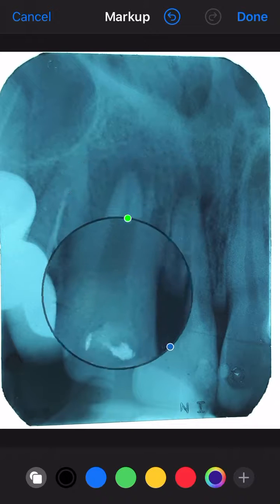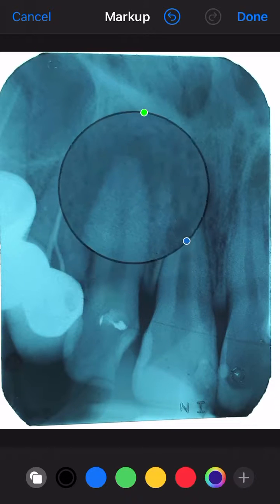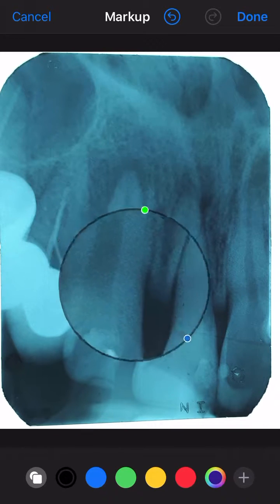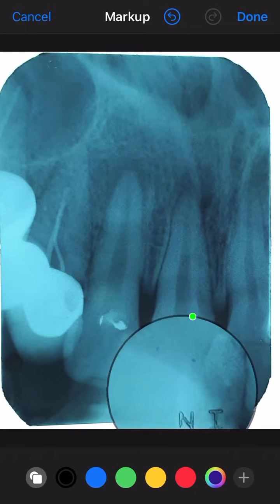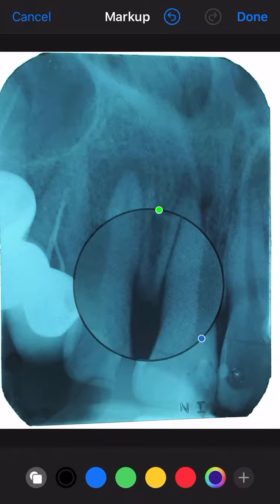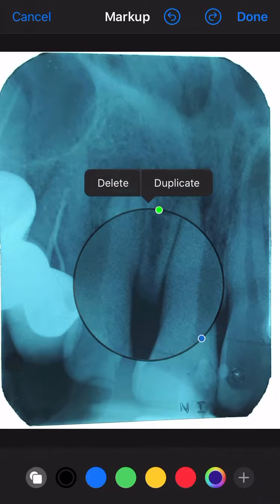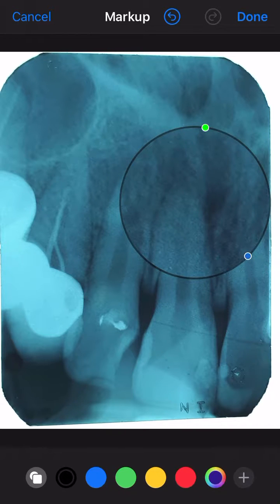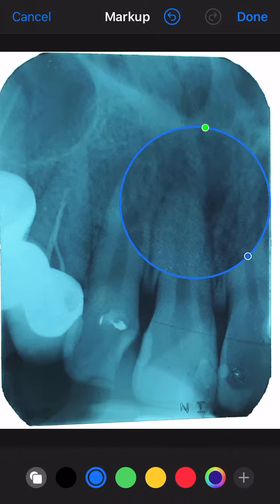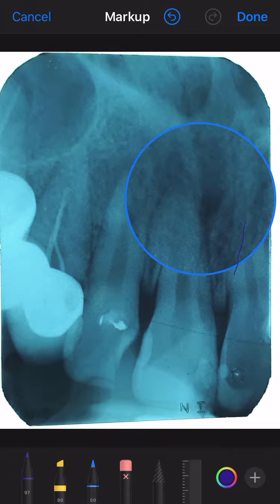Okay. So next, let's come to the roots of the teeth. They look okay. The height of the alveolar bone looks okay. Does it look okay? Yes. Okay. Next, the periodontal space. What happened to the periodontal space? Can we discuss it? Widened. Yes. You can see it somewhere up to here, and then the periodontal space somehow disappears towards the end of the tooth. In these areas, you can't see the periodontal space anymore.